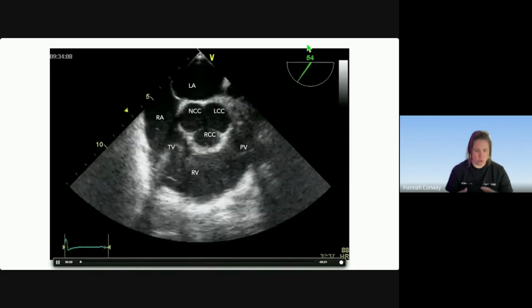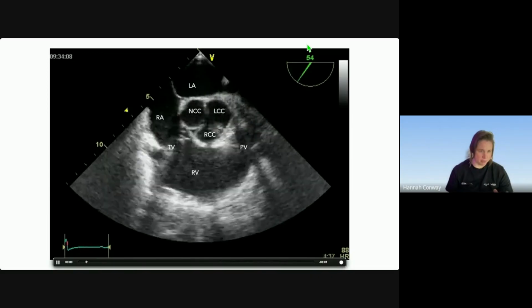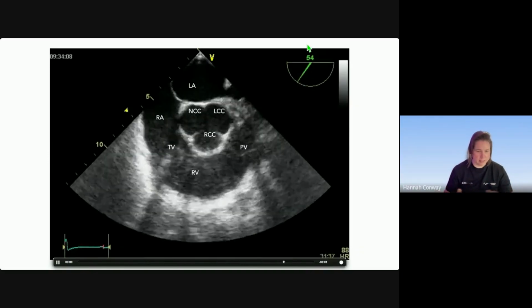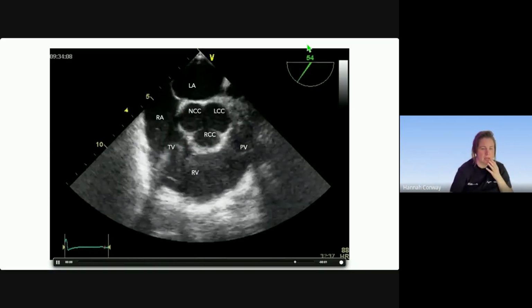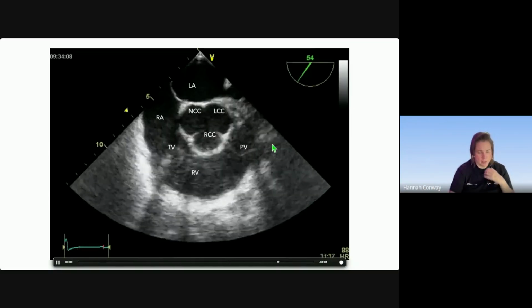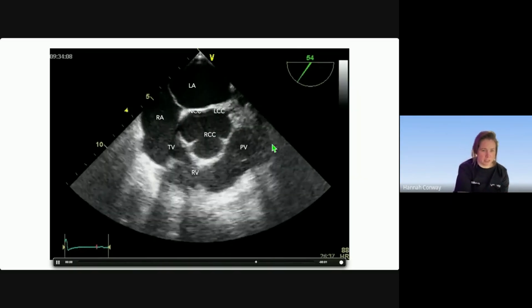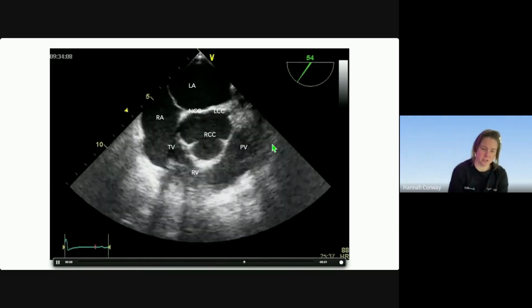You'll normally know about somebody's pulmonary valve dysfunction ahead of time because that'll be a grown-up congenital, for example. So it's unusual unless obviously there's extensive endocarditis. But that's the reason why, because most pathology that we're going to want you to identify will be confined to the left-sided valves and then obviously the tricuspid valve, usually because of either endocarditis or functional TR.